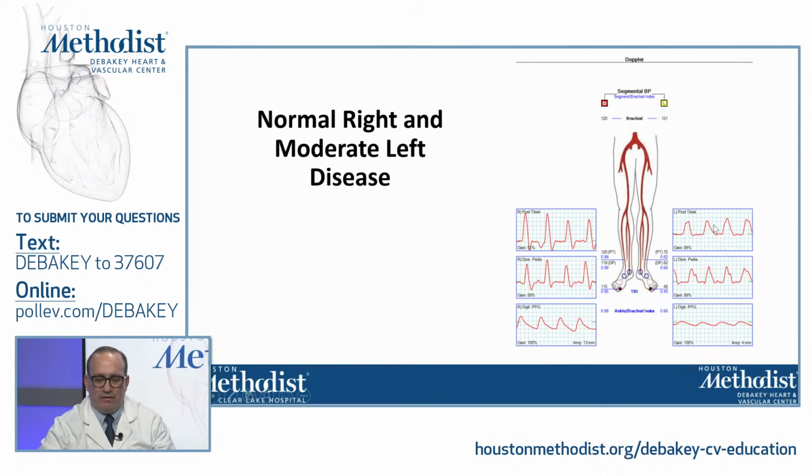I don't see a lot of significant disease, noting that there's always a segment of variability depending on how we interrogate that vessel. But the ankle brachial index on the right side is in the normal range, just in the lower limits of normal. The toe brachial index is also within normal. On the left side, you notice the waveform has just suddenly changed. It's a biphasic waveform. And that is consistent with the findings that we see on our ABI. Our ABI is also decreased.